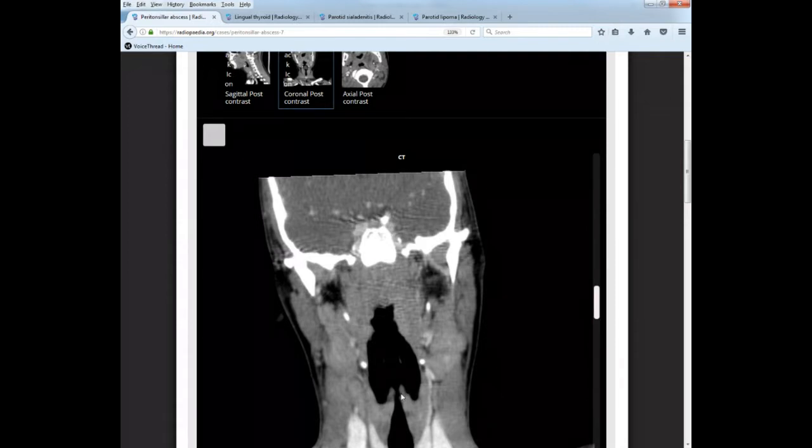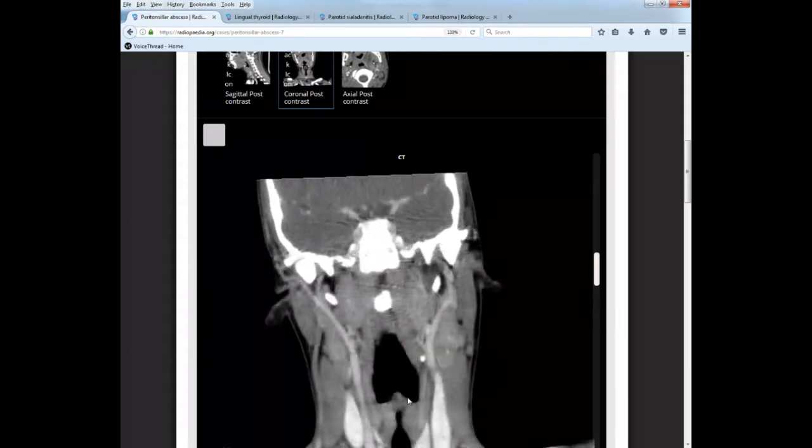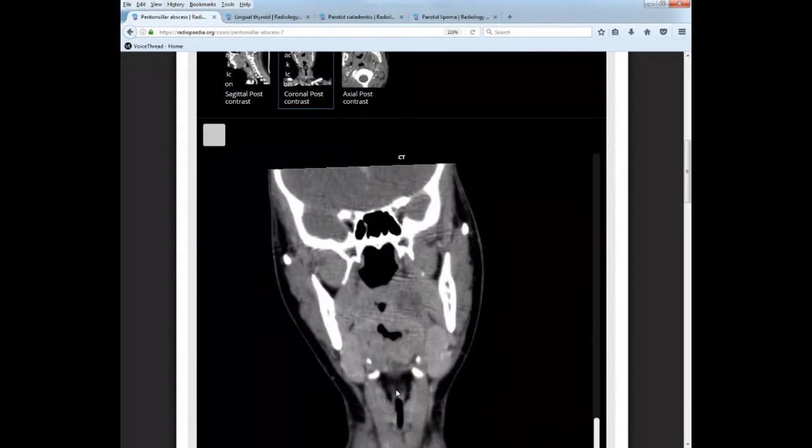And that's going to come into play when we're looking for the cartilages that make up the windpipe or the vocal cords. So false and true vocal cords are in this area. So when you're trying to find those cartilages, look for your piriform sinuses, look for the aryepiglottic folds, and then that will help you to nail down where the cartilages are in the neck.